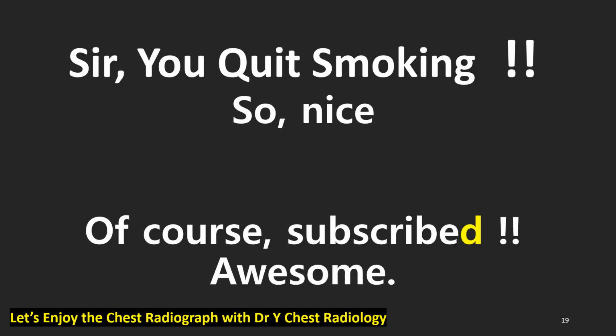Now we mastered micronodular lung disease in the CT scan. Now you are master of micronodules.